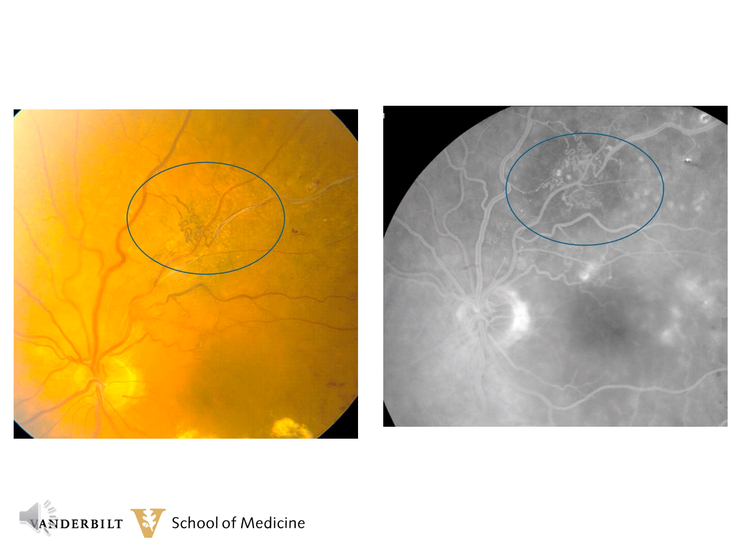If you look at the fluorescein angiogram, you can see some non-filling in the area of the collateral vessels, and also the collateral vessels are dilated, but they do not leak dye. Secondary findings on this are some hyperfluorescence from a scleral crescent, and then some leakage in the temporal macula from the diabetic retinopathy.